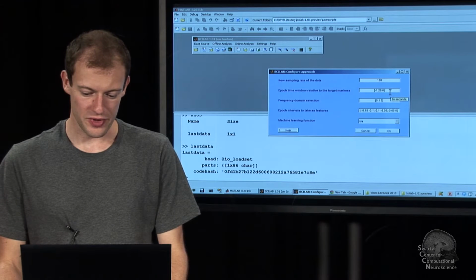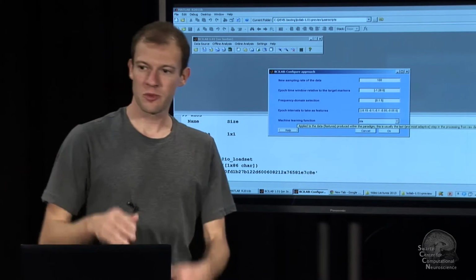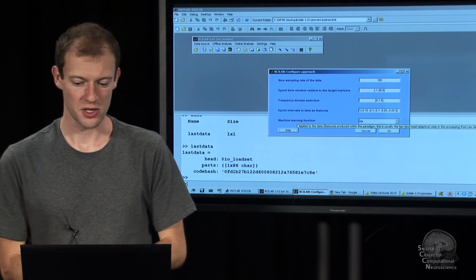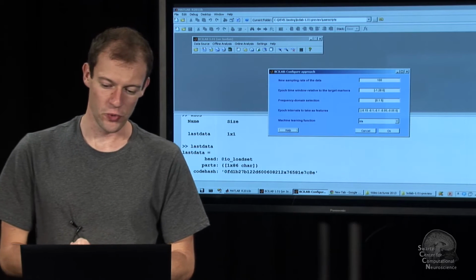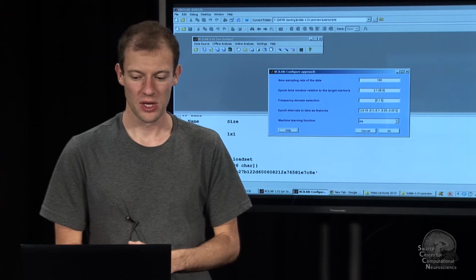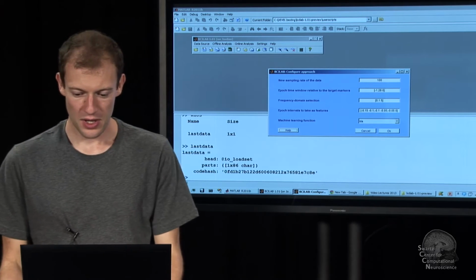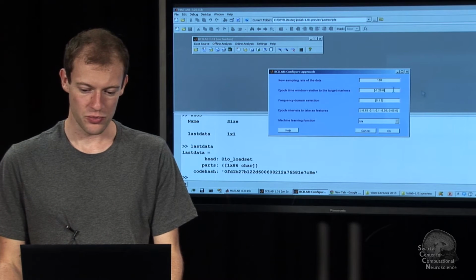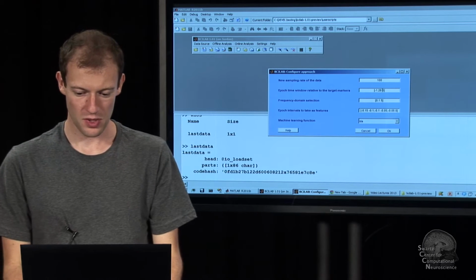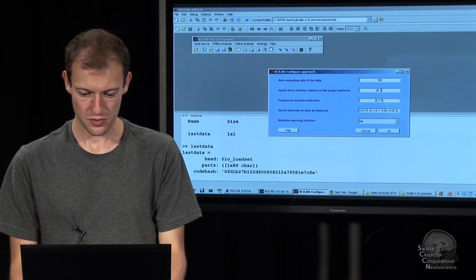What we want to do for this flanker task is the following. We have a person pressing a button. And after that button, we think he's getting some kind of a cognitive response. And we might choose a time window of about, say, a second or so, in which we inspect the data after the button press to decide whether he made an error or not. And so I might put in a general range of interest in epoch for this method, which starts at 0 and ends at 1 second.